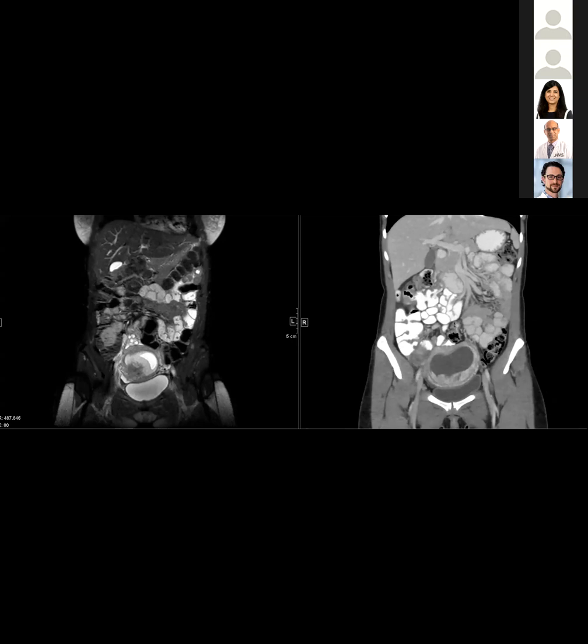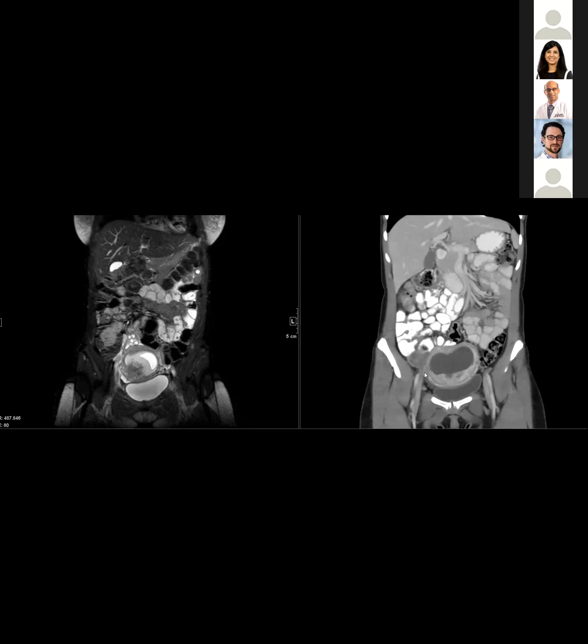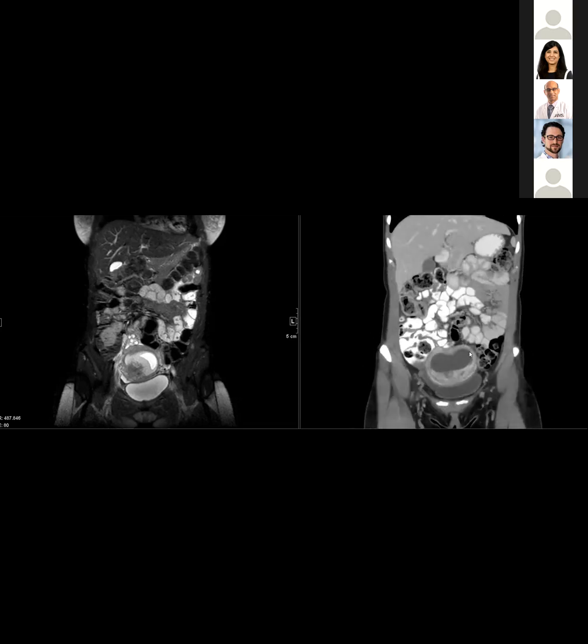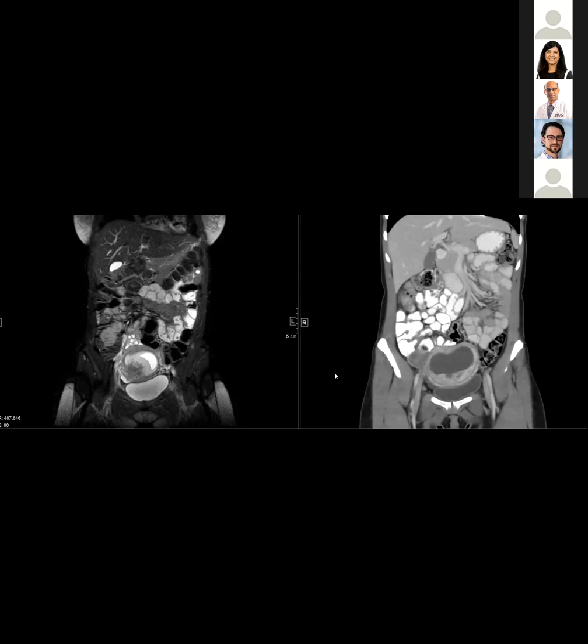I thought so because the location of the ovary is different between the two exams. I think there was a 2-day difference between the studies. You can see here from here to here. Because of the difference in location, and because there's differential appearance between the ovaries, this ovary is a little less prominent and is enhancing better than this one. So I suspect that this thrombosis is related to either partial torsion or torsion-detorsion, but I don't have proof for that.